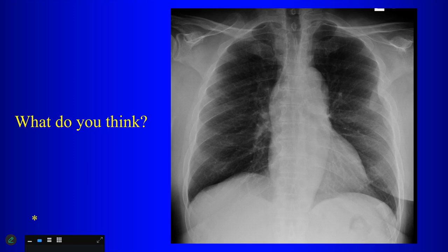Why are you worried about anterior mediastinum? Is that a hilum overlay sign? Where? There's like a bulge. On what side? On the right. Here's the hilum on the right. I don't see anything over it. Nobody sees anything on this chest X-ray?